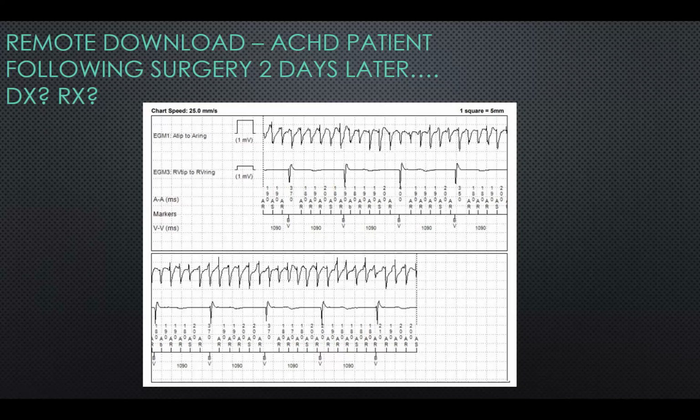But essentially, every time you see the letter A, it's responding to something in the atrium. Yeah, so I see that there is an AS beat, and then that's followed by the V paced beat. And then there's a period of atrial refractory period, and then AS, and then V paced.